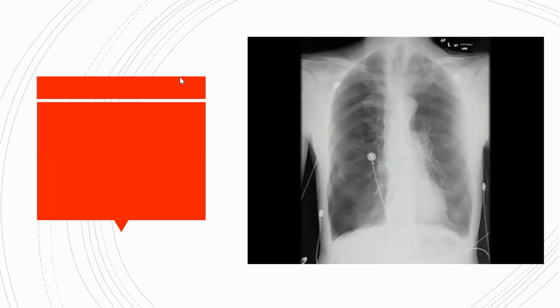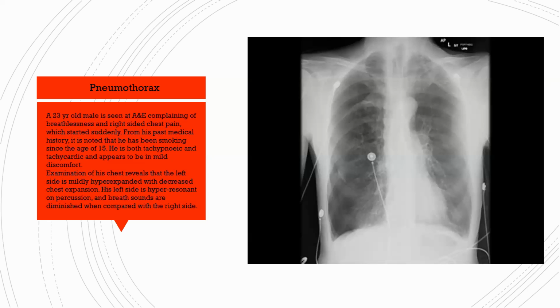So keep that in mind. That will remind you to always, even if you've noticed something wrong, like COPD, definitely remember about the pneumothorax, okay? In fact, COPD makes you more likely to get pneumothorax, so it totally makes sense. Perfect.